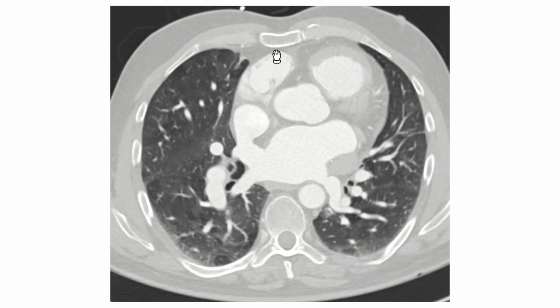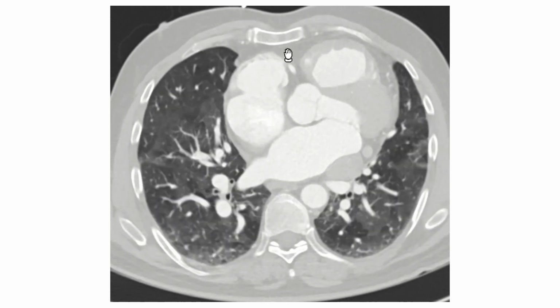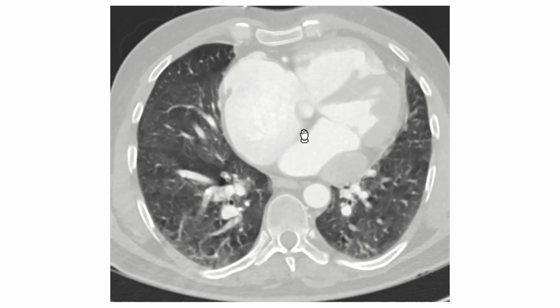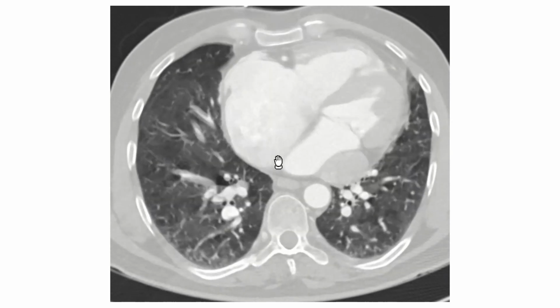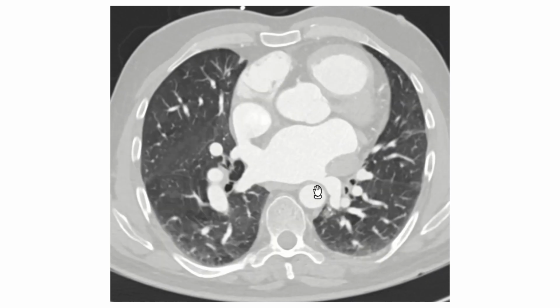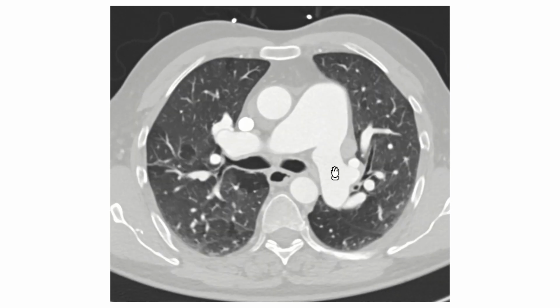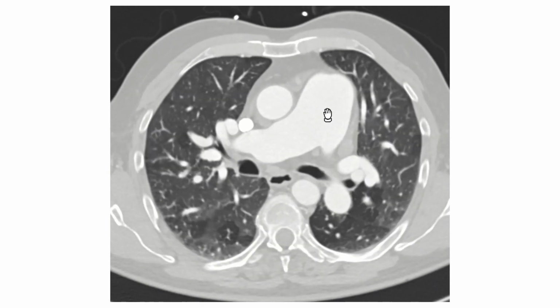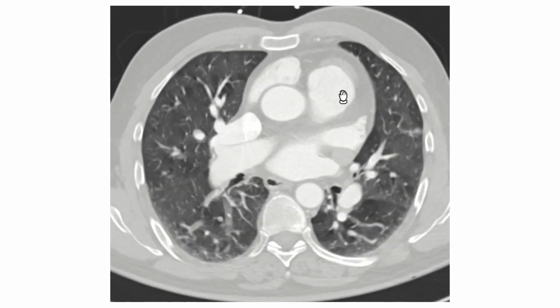Scrolling further down, we could see that the right atrial appendage is very close in proximity to the sternal wires, with a dilated right side, so a dilated right ventricle and dilated right atrium. But before going down, we could check the VA and AV concordance. We said that there is going to be a normal concordance because of the arrangement of the pulmonary.